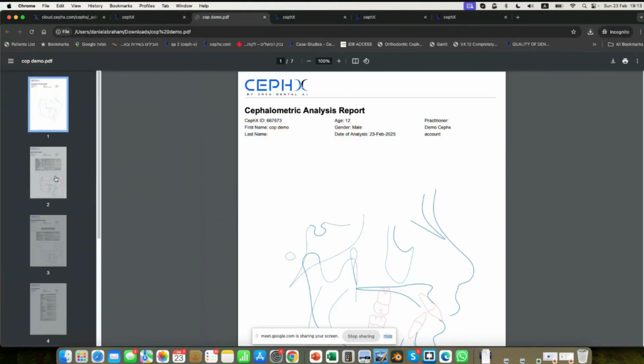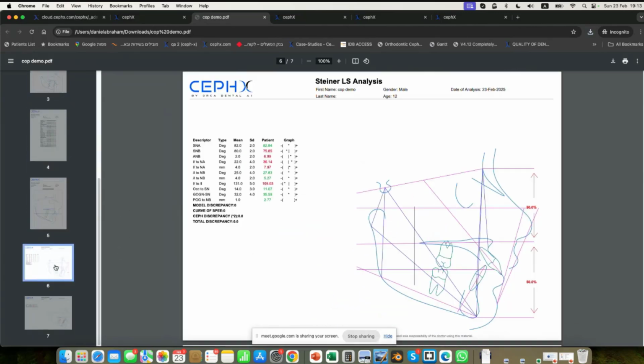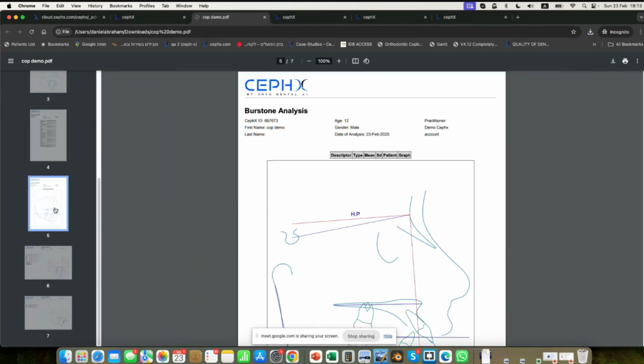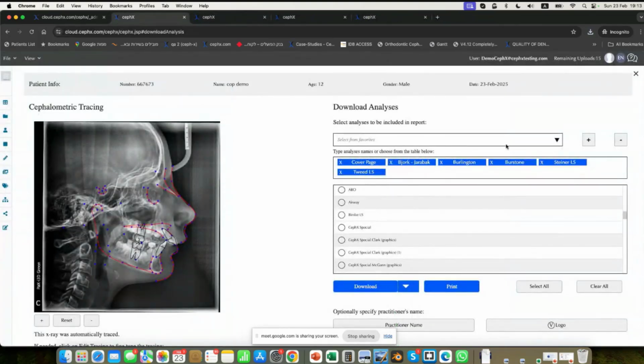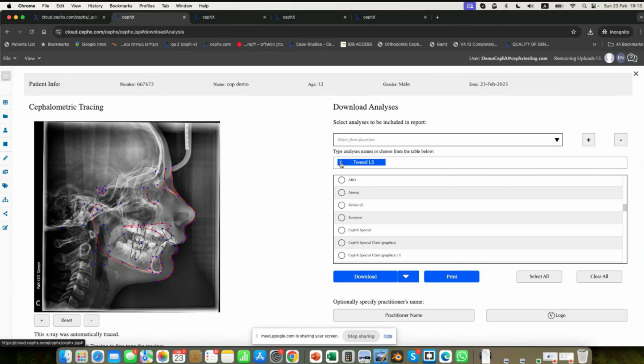It's ready. You really had not much effort in order to get to these results, right? So we've got, again, different layouts. I think we have a demo here of Ceph and background layout, so you can have it over the Ceph, you can have it over the profile, and again, just a lot of different options.